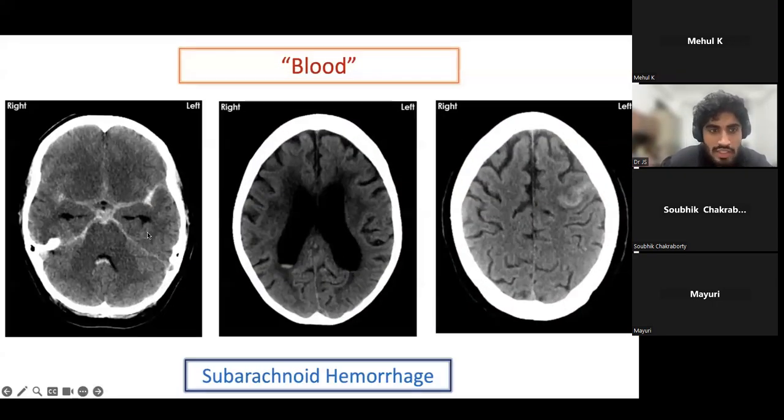You can see here, this is a star. And if we have any white color in a non-trauma patient, we should suspect what? Spontaneous subarachnoid hemorrhage. So we need to look for any aneurysmal bleed. In an aneurysmal, spontaneous, non-traumatic bleed, usually there is a role of clipping and coiling, because it is not due to trauma. So usually we'll go ahead with CT angio to confirm that.